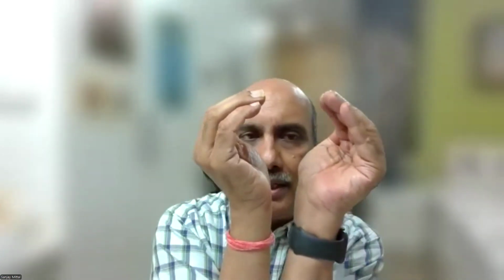And if I see a segment which is outpouched, ballooned out in diastole as well, as in the first case I showed you, there was a ballooned out segment in the diastole also, this is aneurysm. So as the wall motion abnormality increases in this order, we increase the number given to them. So normal would be 1, hypokinesia would be 2, akinesia would be 3, dyskinesia would be 4, and aneurysm would be 5. So the higher the number, the worse is the chance of that segment having surviving muscle and recovery, and poor is the prognosis.